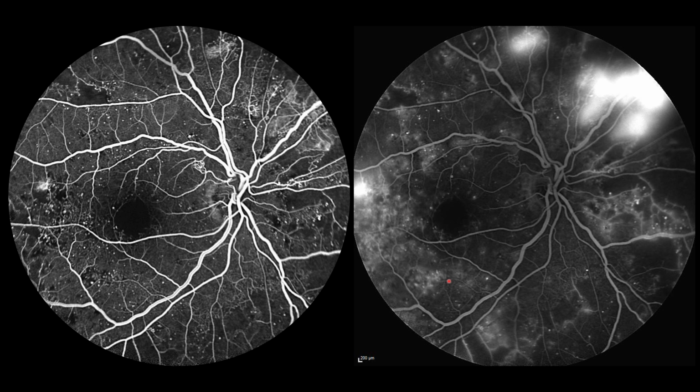But if you look at, for example, this area, there are some small white dots which have become fuzzy. That means they are leaking microaneurysms. For example, this is a very good area. If you just compare this area with this area, you can make out that here we can see the individual white dots, but if we look here, it is very difficult. They have all become fuzzy. So these microaneurysms are leaking. So that is how we can look at each pattern and how it is changing over time and then comment.